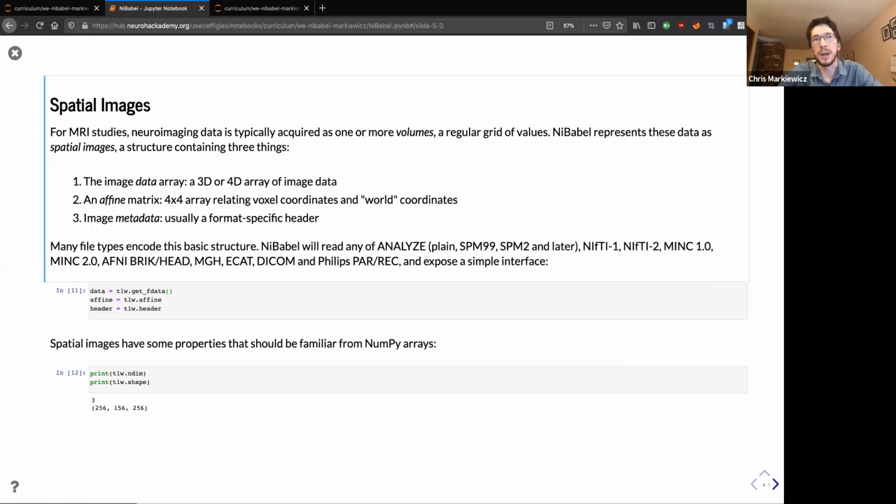For instance, it doesn't get gzipped, so the size of the byte string is the size of the uncompressed NIfTI. But yeah, if you're sending something over the network, you can always gzip the stream as well. Okay, I'm going to move on.